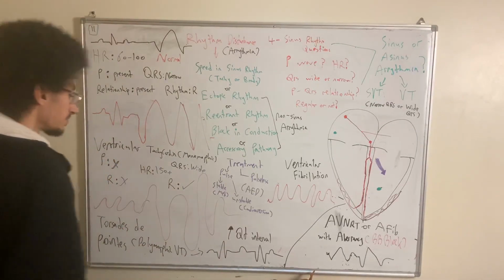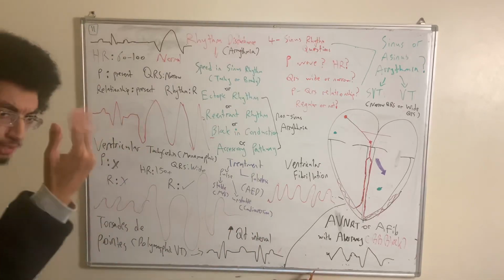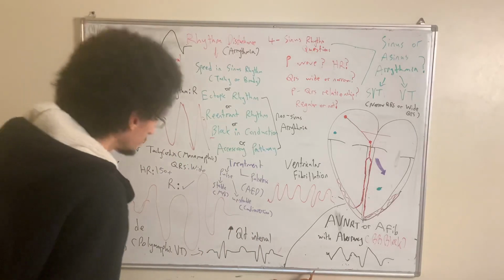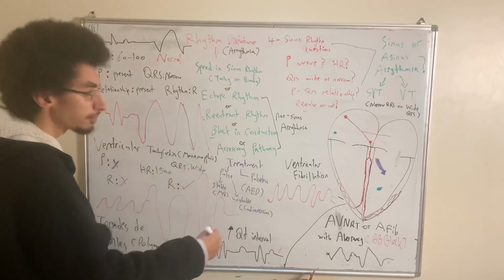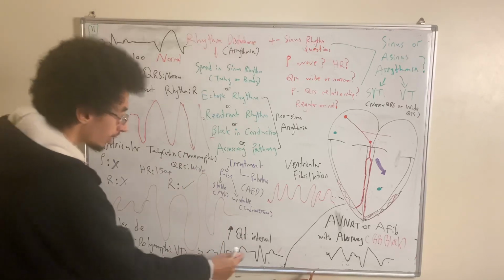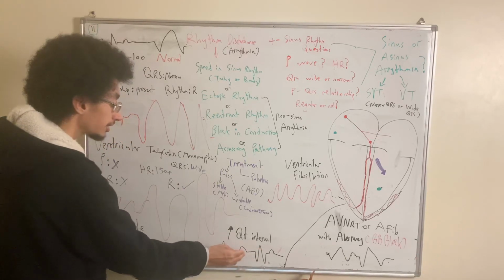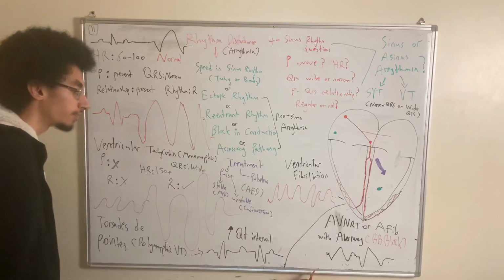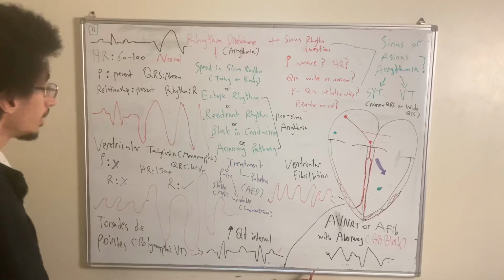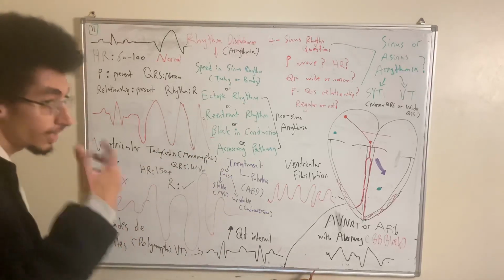If a person has a prolonged QT interval. Remember what we mentioned about the QT interval in the previous video? If the QT interval exceeds 50% of the RR interval, basically the T wave is practically in the middle between this beat and the next, this is a prolonged QT interval, and this is very dangerous. And unfortunately, it's very common. Why is it common?